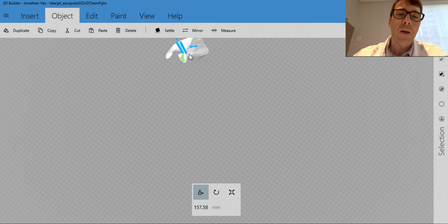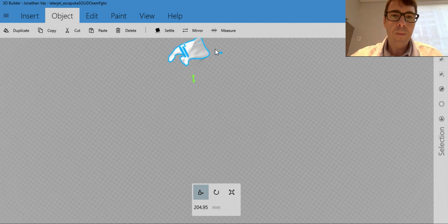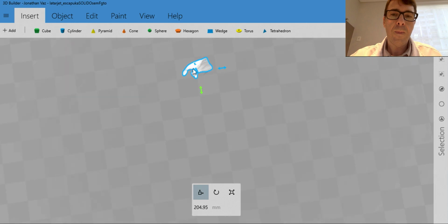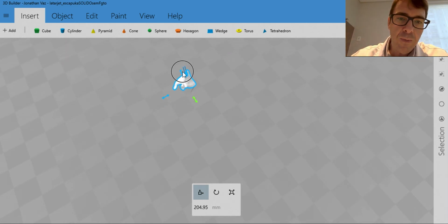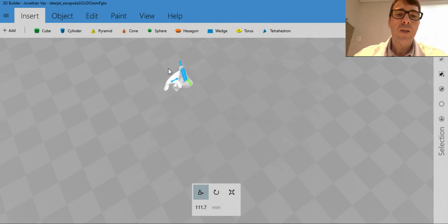We are almost done. We must move down a little bit. Let's move over here. Let's zoom in.